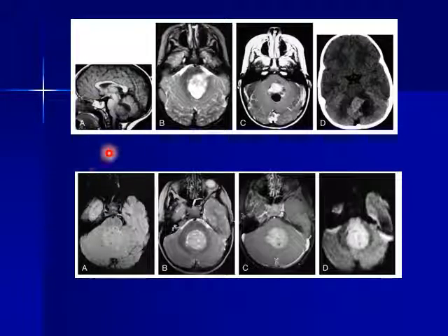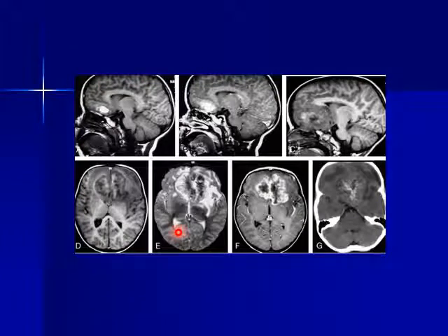These are the different appearances of atypical teratoid rhabdoid tumor, and as you see, it is more or less simulating medulloblastoma. Again, it is involving here the frontal lobes, simulating glioblastoma multiforme, okay, with an irregular ring, necrotic pattern of ring enhancement, but the age here is the clue.